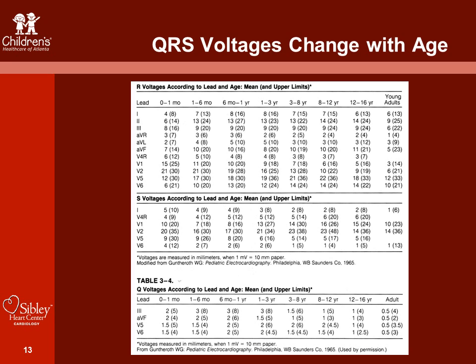And again, this corresponds to the change in the relative ratio of left ventricular to right ventricular mass. Whereas the S wave in a newborn in the left lateral precordial leads will be more dominant. And again, if there's any sort of question about whether there is either left ventricular hypertrophy or right ventricular hypertrophy, just refer to the age-matched normals.